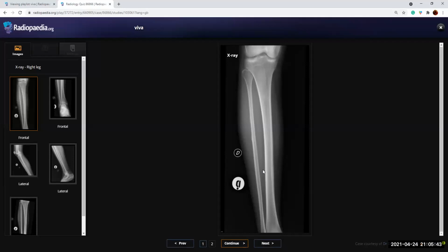Very slight periosteal reaction is noted in the fibula, mid diaphysis, I think. Yes, I'm suspicious of this diaphyseal periosteal reaction. Okay, so if you see that, what would you want next? I'll give you another view, but it's not seen well in the lateral, so it wouldn't add much. So what do you want next?